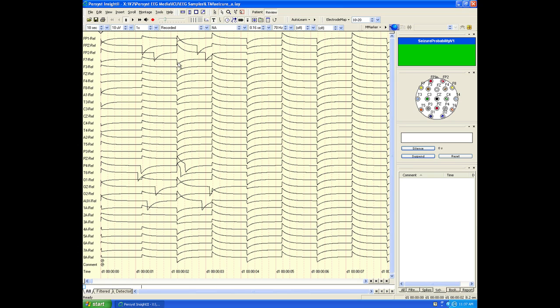Note that the square wave calibration signal is mostly flat. Persyst spike detection calibrates its gain during the first 3 minutes of the EEG. Therefore, if you do run square wave calibration, it should only be done for a page or two at most.